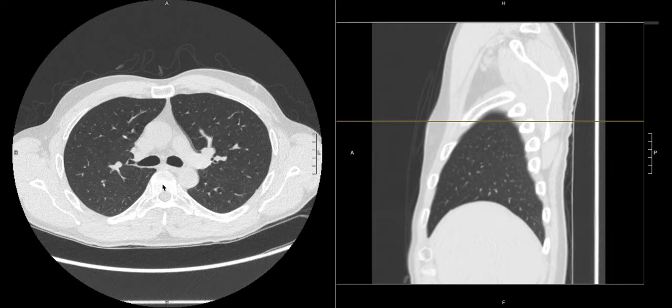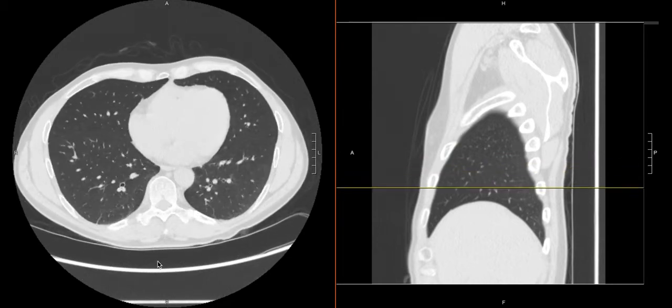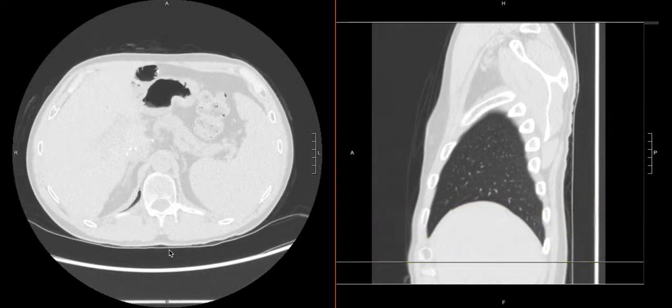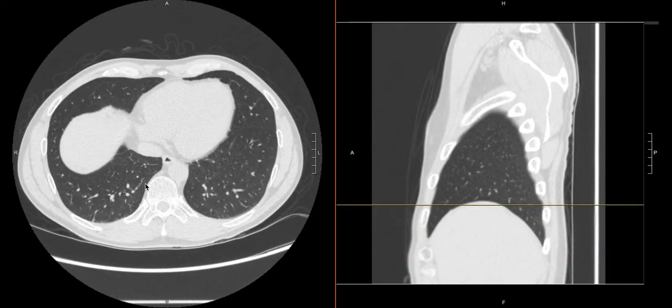And then we can just, again, scan through, look at the right lower lobe, look around the mediastinum, look around the chest wall here, look all the way down into the diaphragm, make sure we're not missing anything over there. And it goes without saying that as you're looking for these masses and nodules, you're also looking to appreciate things around the pleural space.